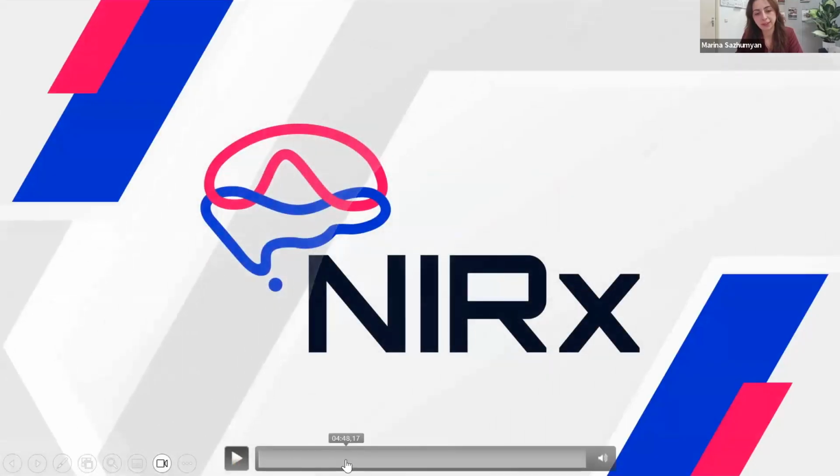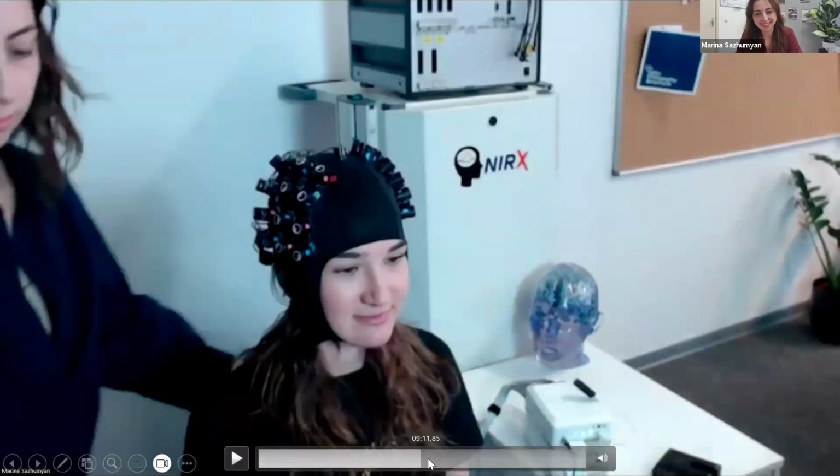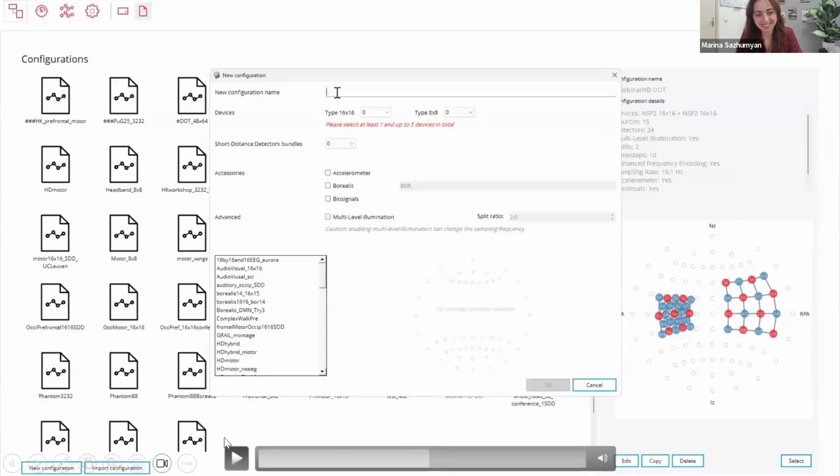No, I clicked the wrong time point. I'm very sorry about this. Okay, we're back.